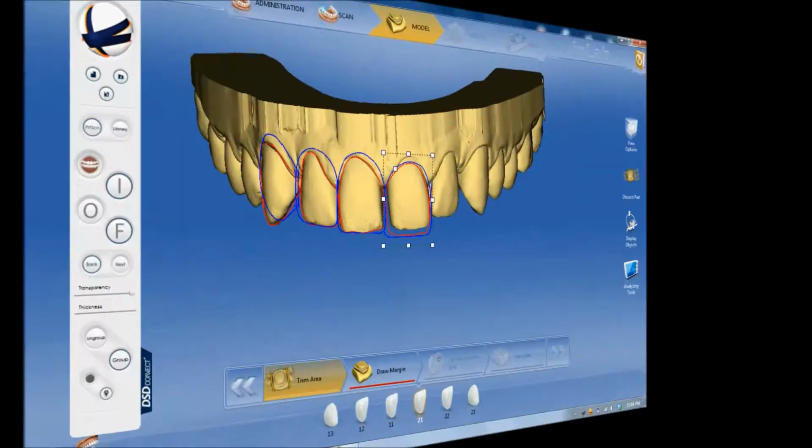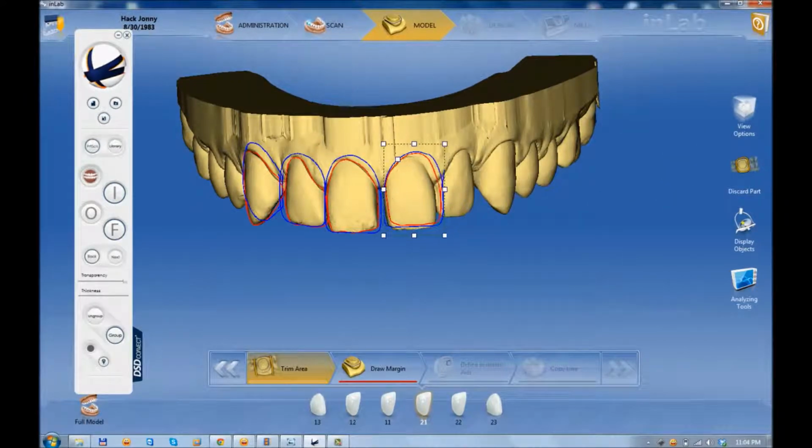The position of the DSD images, pictures, selected contour of the tooth, or the image with the axis can be moved using the mouse or gradually from the arrows of the keyboard, or more delicately, also by pressing the Shift button.